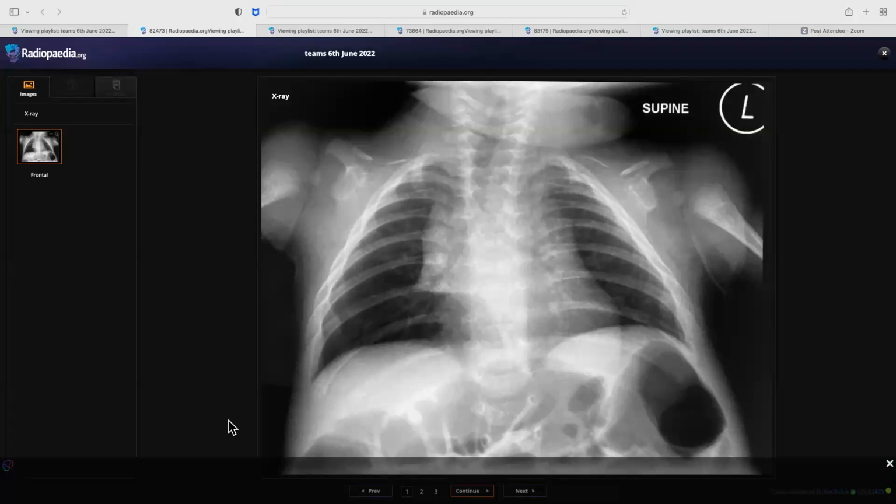Okay, going back again, since I got some clue that I have to focus on the bones, there is some soft tissue swelling and some irregularity of the glenoid of the left scapula. Bones.